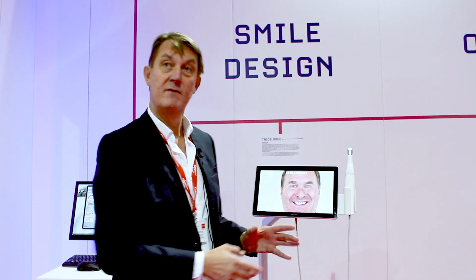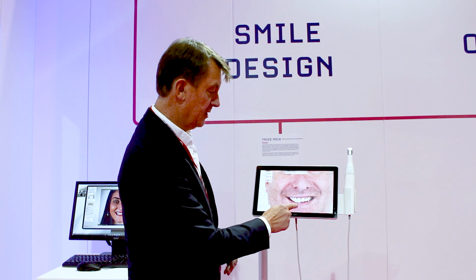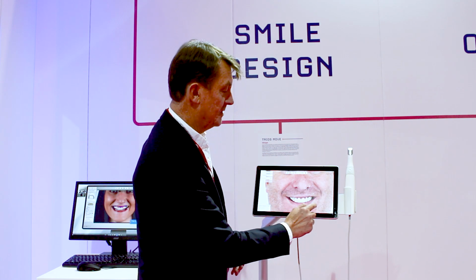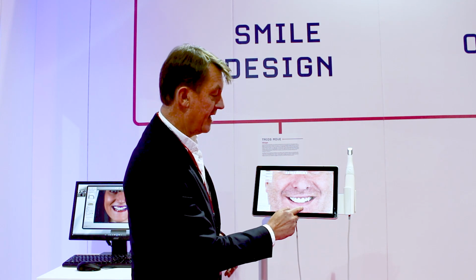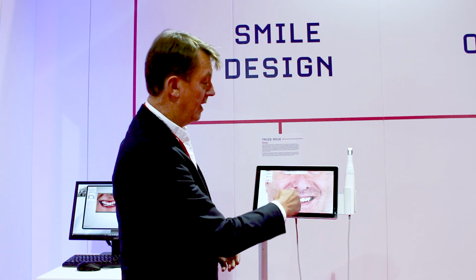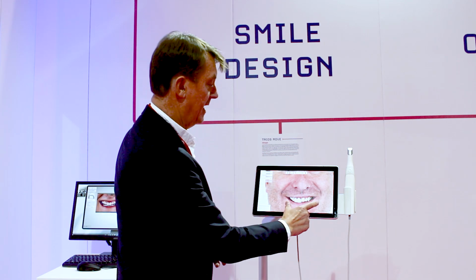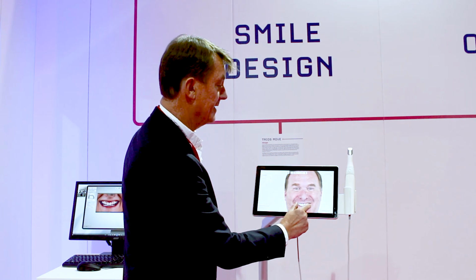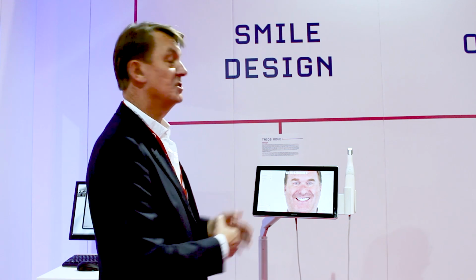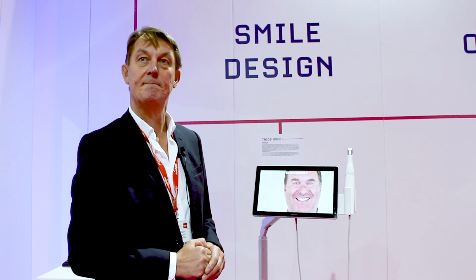And then we have this very, very useful tool whereby we have a little slider, which we can say, that's how it was before, and this is what we can do. But if you move that into a central position there, it gives a very good explanation to the patient of that variation in teeth, tooth color, tooth design, and if we just shrink that down a little, then the patient can see what the outcome of the smile design will be. Very simple tool, very easy to use, and explains to the patient exactly what we're looking at.